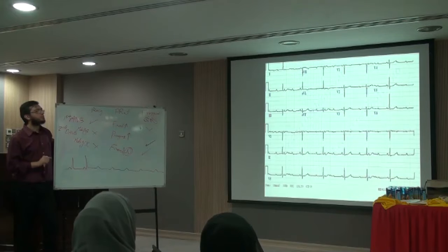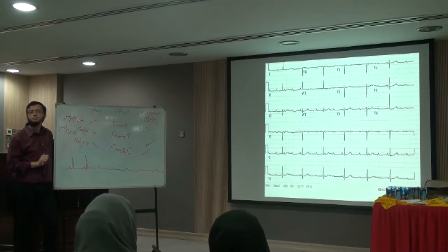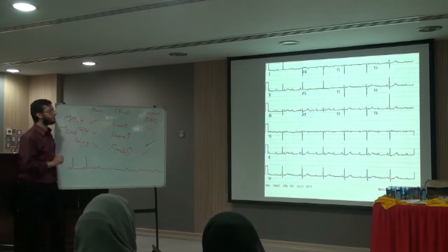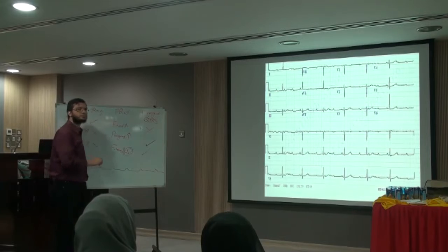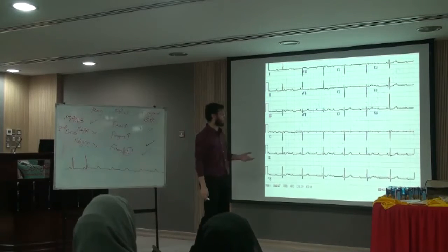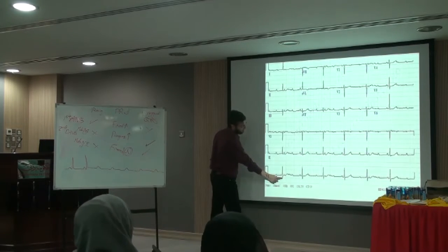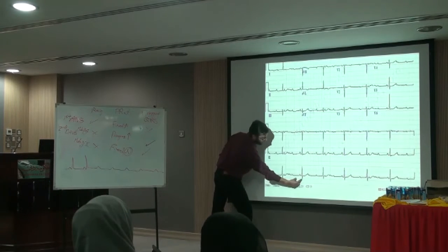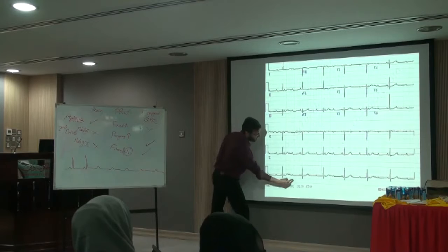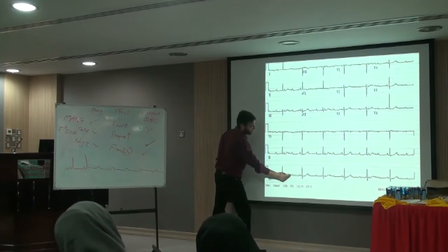All right, what about this one? Type 3. So why did you say type 3? Excellent. No correlation between the P and the QRS complex. So this P is coming far away from this. I'm expecting that if it were first degree AV block, it would come at the same distance. But no, it came at a different distance, far away from the P.